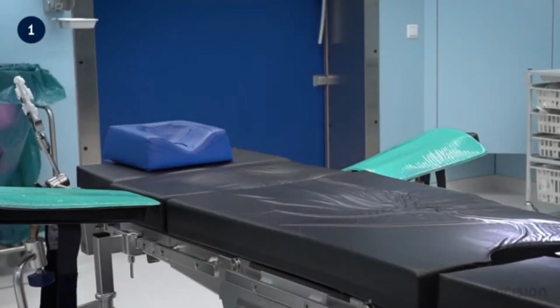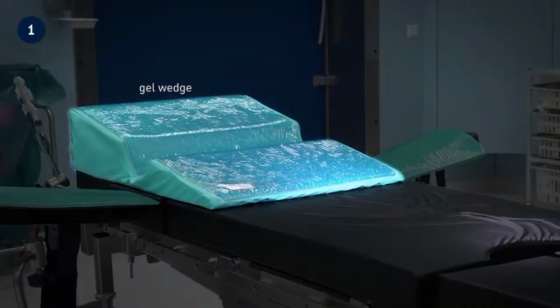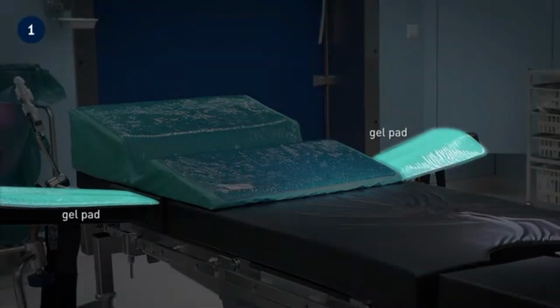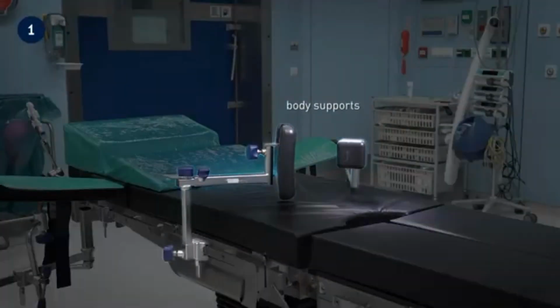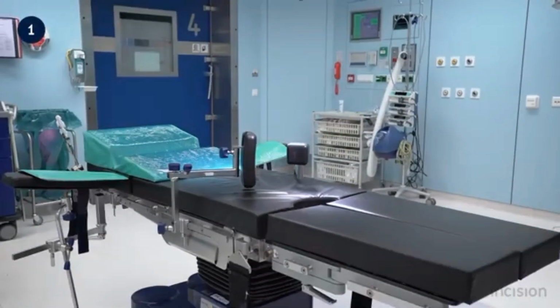Other accessories used to prevent pressure complications include gel wedges, which are used when the patient is placed in a lateral position. This accessory has a groove for the dependent arm. Also of note are gel pads, which are used to protect the skin and nerves of the arms. Other accessories that may be used are body supports, used to support the pelvis anteriorly and posteriorly when the patient is in the lateral position.